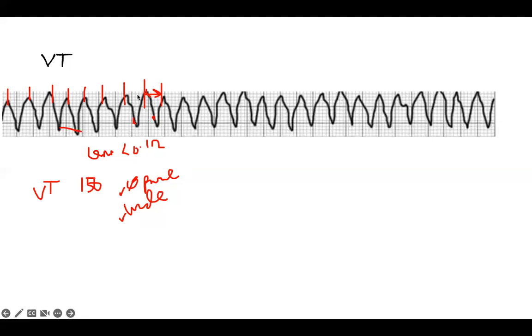And because it may be buried in this, and then the rate is very high. So this is what it looks like. And it's a ventricular rhythm. So the atrium, the SA node, is sitting there trying to fire as the pacemaker, but the ventricle is already doing its thing. It keeps on firing non-stop. So the impulse is coming from the ventricle. It itself is firing and causing this problem. Because of that, it causes a lot of problems for the patient.